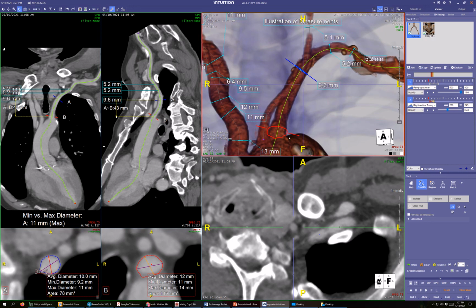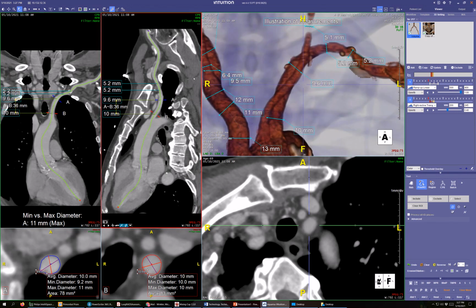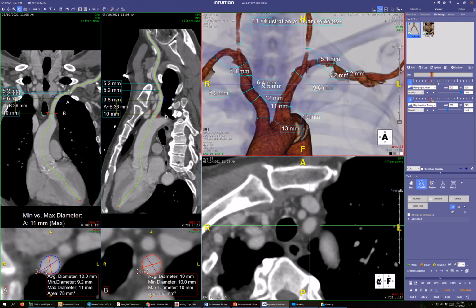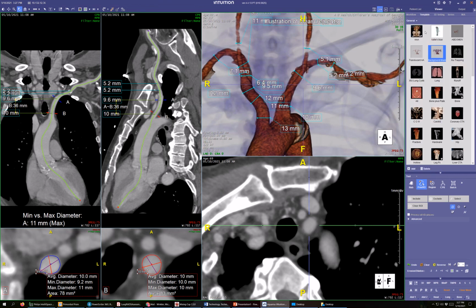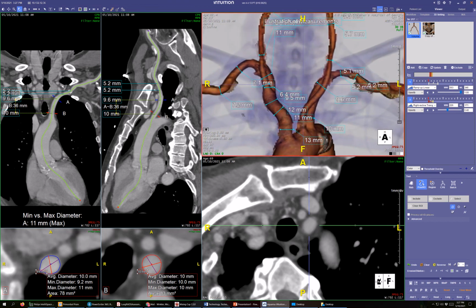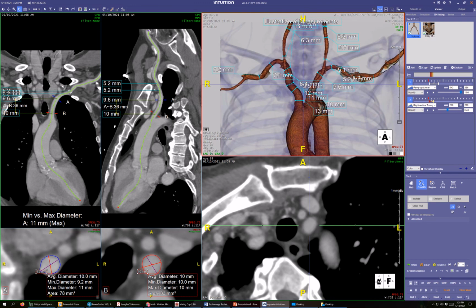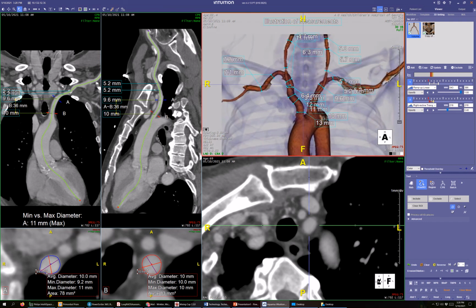It's interesting how some things it can do really well on its own, like selecting circles, and some things it's not, like following some vessels. Other things it's got some cool features. Yeah, one of the things we work on in the laboratory is noise reduction, and it gets to be real important. Yeah, that's something I was looking at too. On a lot of our CT scans in internal medicine, there's the base image, I guess, and then the IMR. Yeah, the IMR is a form of Philips' proprietary iterative reconstruction.